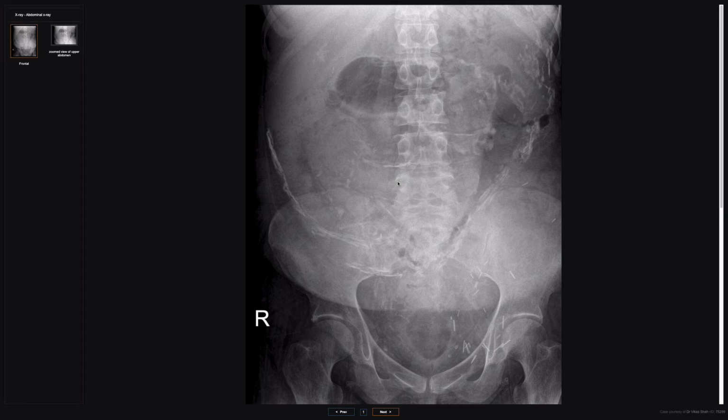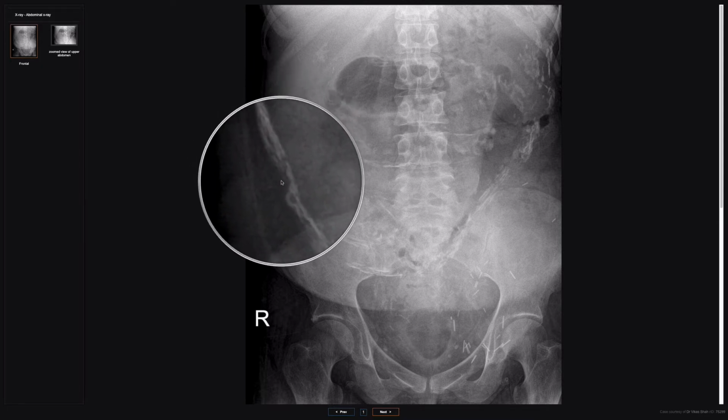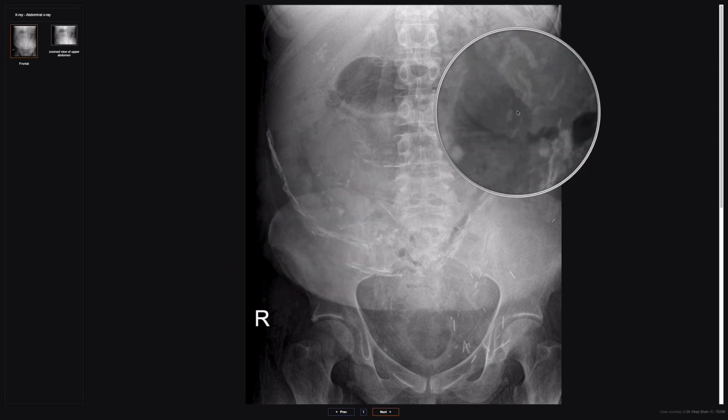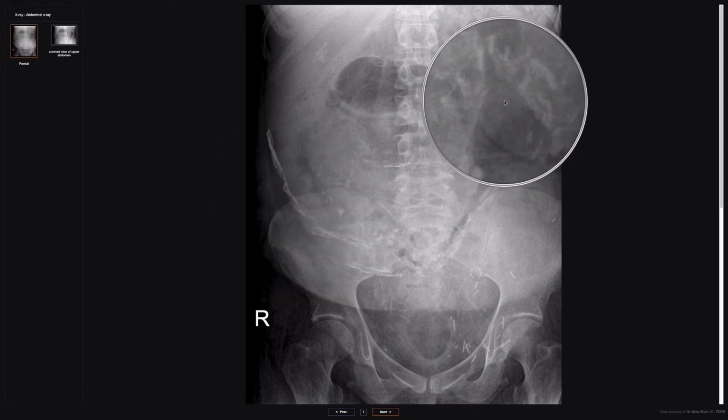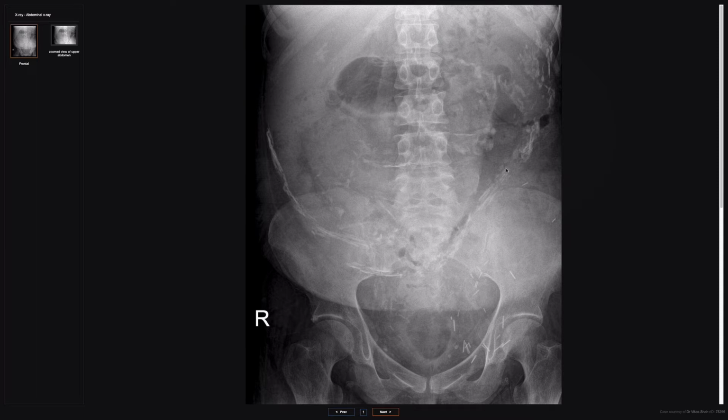Another structure that can become calcified is the peritoneum. Again, we don't see this very commonly. So here, what we've got is this kind of diffuse, along this side linear, quite thick, heterogeneous calcification, and on the left side here it looks more patchy and amorphous, and it doesn't really follow any particular organ system, right? This is not the outline of the liver or the kidneys or the spleen. So when you've got this kind of calcification which spreads along a wider area, doesn't conform to an organ system, it's a bit blobby and amorphous, think about peritoneal calcification.